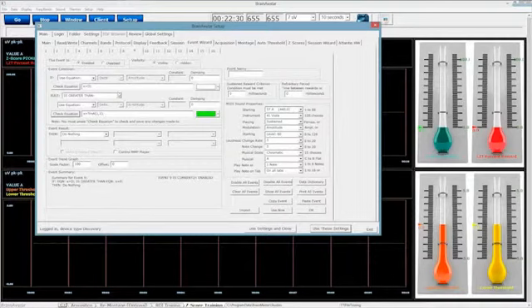Once again, in certain circumstances, with one-channel training, you're probably going to just stick with the variables because they're very easy to use. There's not much of a change to them. It's D, whereas here I had to do all this typing and I had to realize what I was looking at. Where does this come out as the winner? When you start changing the variable and you don't change its definition here.